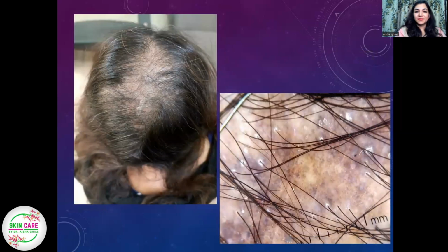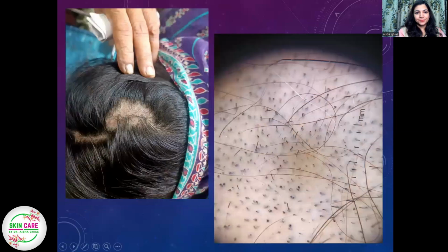All right, case number 5. Also, loss of hair from the middle of the scalp, and on trichoscopy, lots and lots of globules and dots, dots and clots of pigmentation on the scalp with empty hair follicles, no follicles. Some of the hair follicles are having scaling in them. And then focus on this, the hair density is pretty much reduced. Also seems like an inflammatory disorder.